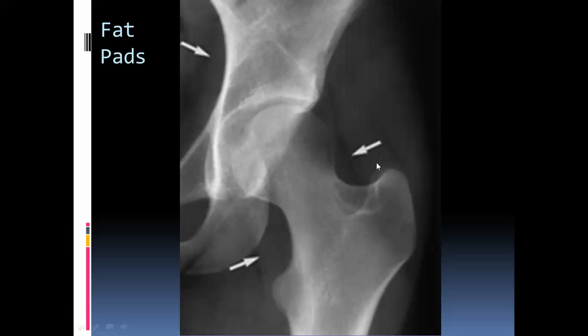This one with this fascial plane is the glutei, and this is the iliopsoas muscle. So we can see the surrounding muscles because of the surrounding bed of fat. Again, obturator, glutei, and iliopsoas muscles.